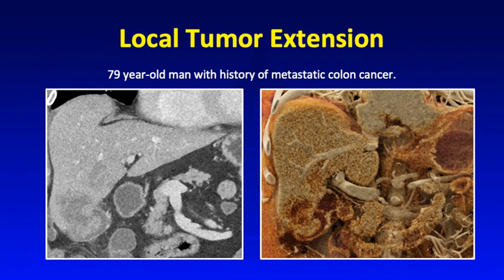Another example here with the cinematic rendering, it can accentuate the depth perception so that we can really appreciate how this metastatic colon cancer is invading into the lumen of the gallbladder, and it will help the surgeon's visualization and treatment planning.